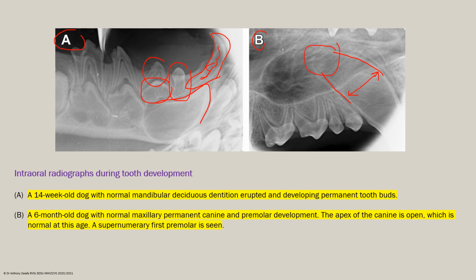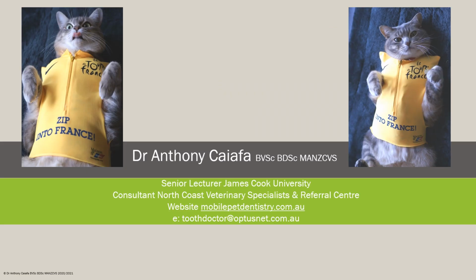You can also see on this image that we have a supernumerary premolar tooth, so there's two first premolar teeth here, so one of them will be an extra tooth. You can see the alveolar process of the maxilla, and you can also see the conchal crest here, and that's where the ventral maxillary turbinates attach. That's all considered normal.